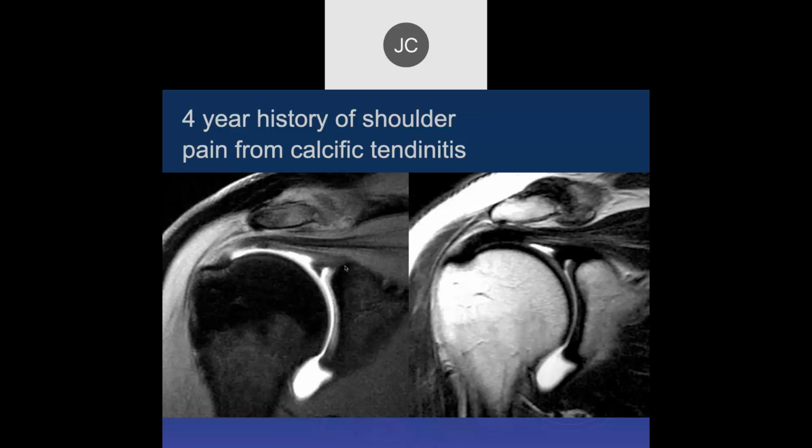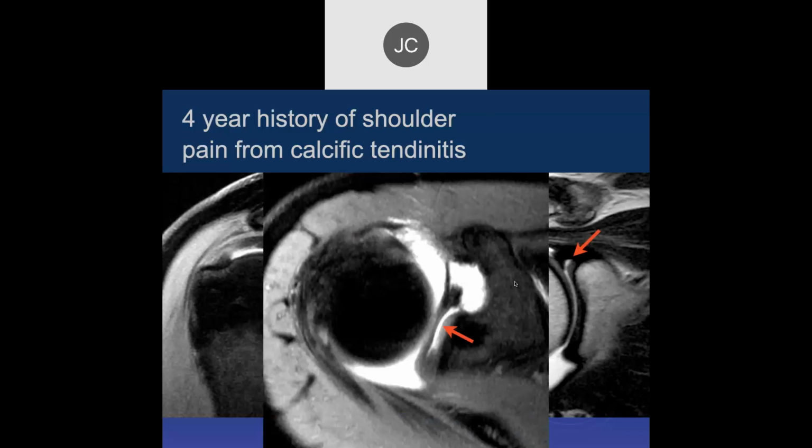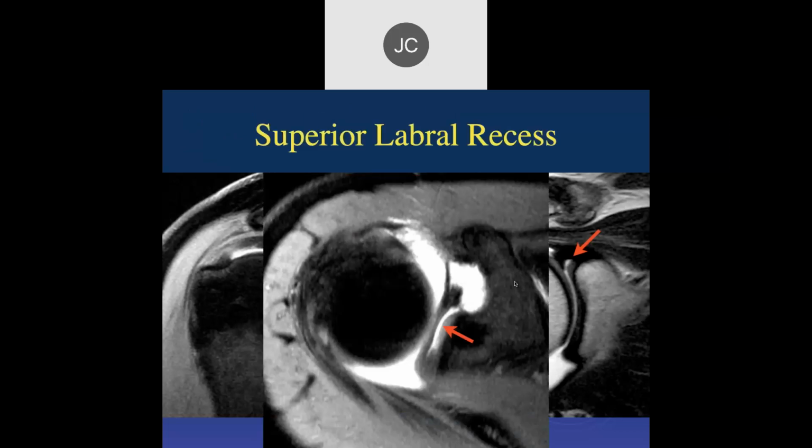And that was a big deal, and we'll talk a lot about typing superior labral tears later in this particular talk, and we'll discuss the significance of that. Okay? Superior labral recess.